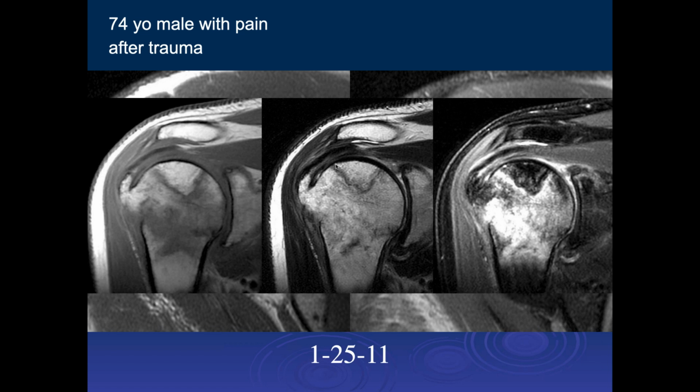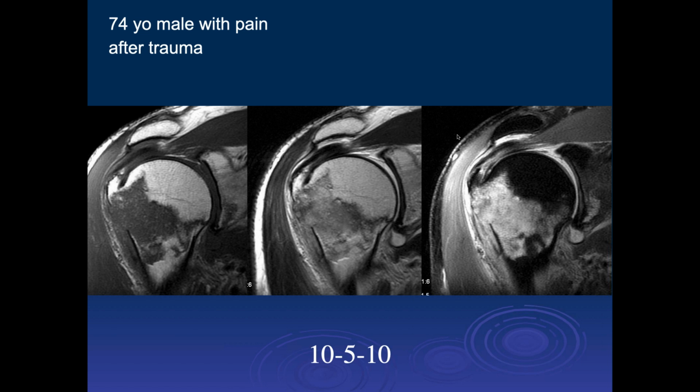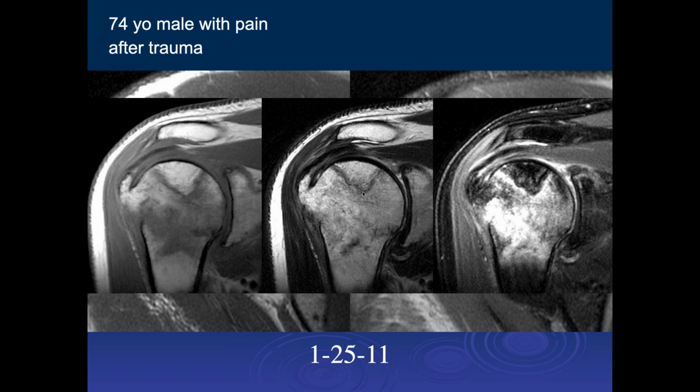Let's continue with the differential diagnosis here first. Yeah, let's do that. So I guess the question is, what do you think this area up here is? And then here are just some other images going up higher. And notice that superior area was not abnormal right after the fracture. So what else could it be besides the fracture up there?